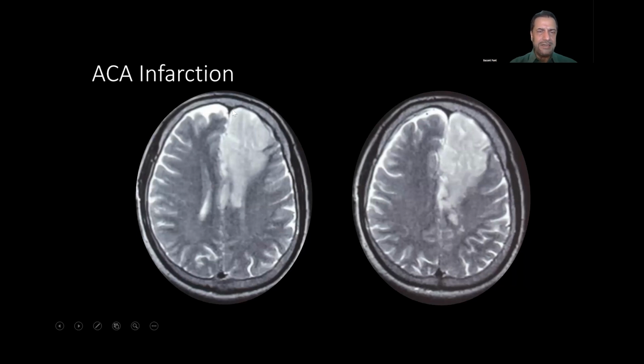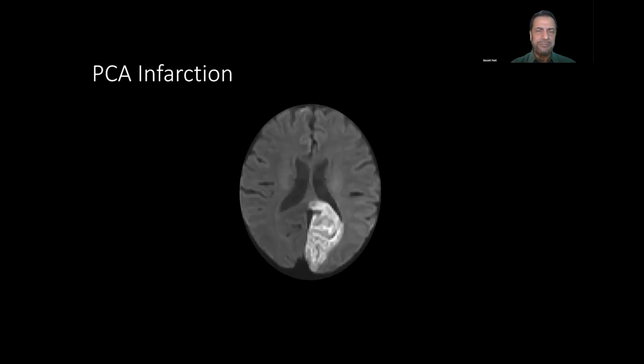And if you have an anterior cerebral artery infarction, then it will look like this, the anterior cerebral territory. And if you go above, it will come back and back, and all of the leg area will be infarcted. So they will have deep leg weakness.